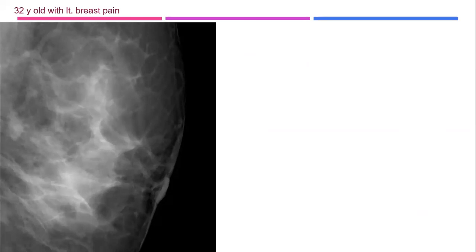You cannot decide on this. You can say projected over the pectoralis, suspicious for invasion. Yes, this is a zoom view. I have missed the standard. These subtle spiculations were not very clear on the standard view.